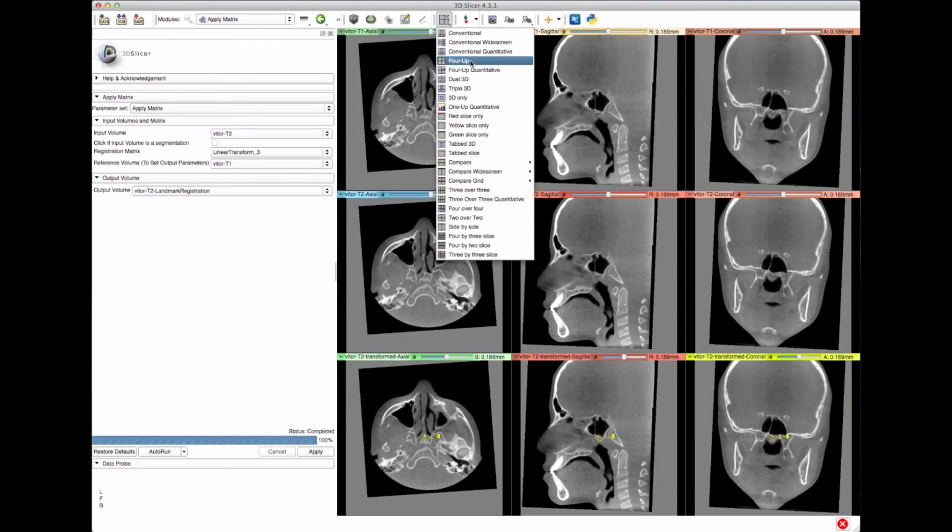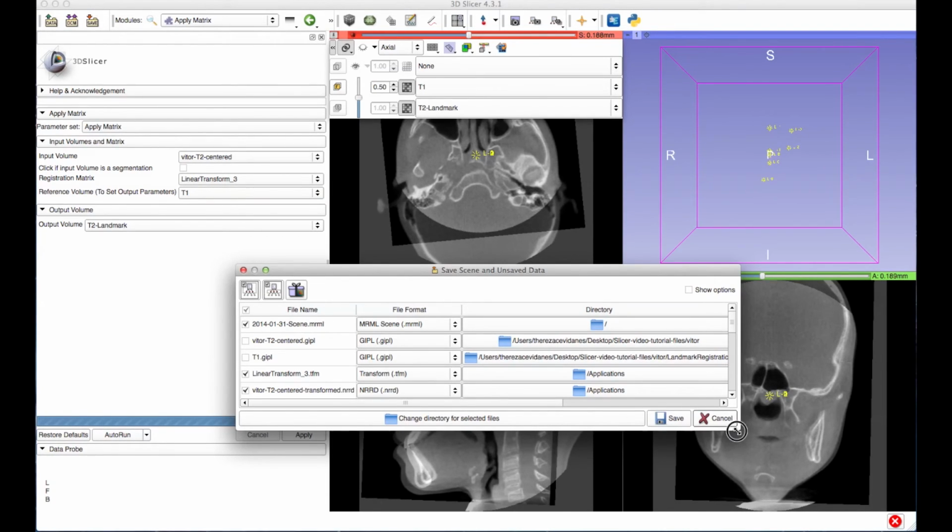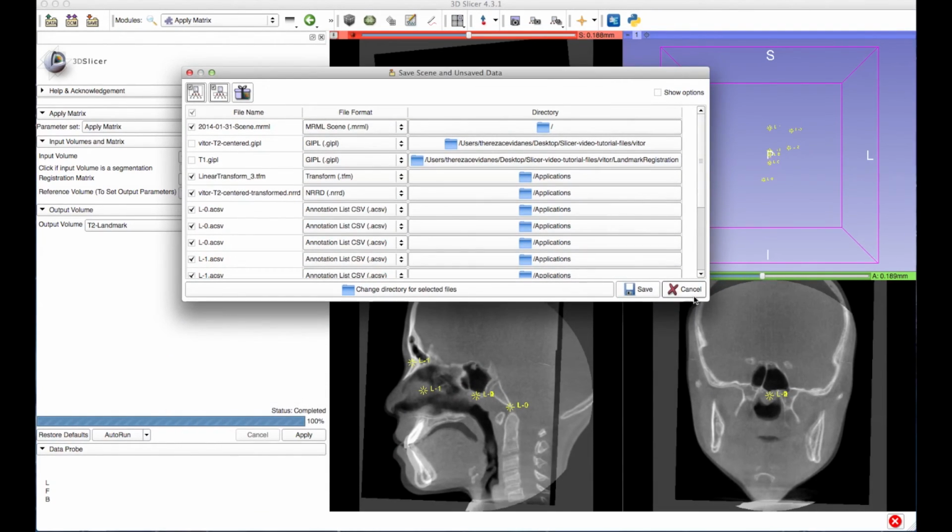You can select a different view if you wish. Make the overlay again in the same manner as before, with the newly created file. Do this to double check the superimposition. Finally, don't forget to save the files. You can save them in whichever format you wish.